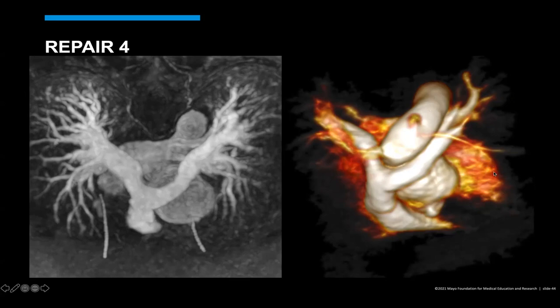Here's a little bit of the left ventricle. Here is the right ventricle, pulmonary artery. What's unusual about the anatomy in this case is that the main pulmonary artery is in front of the ascending aorta, and you see the right and left pulmonary arteries branch over the anterior aspect of the aorta, which is not normal.